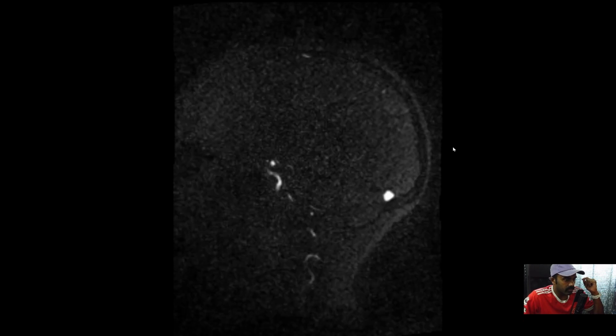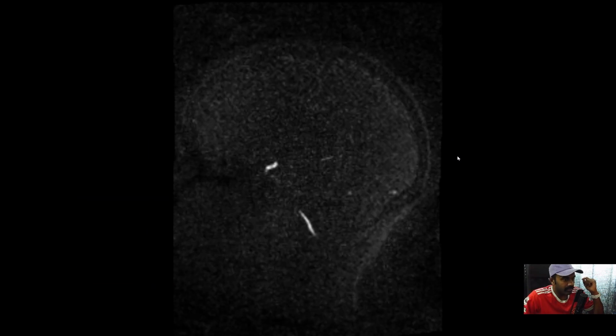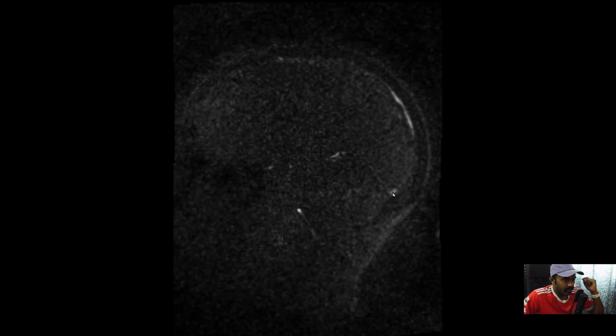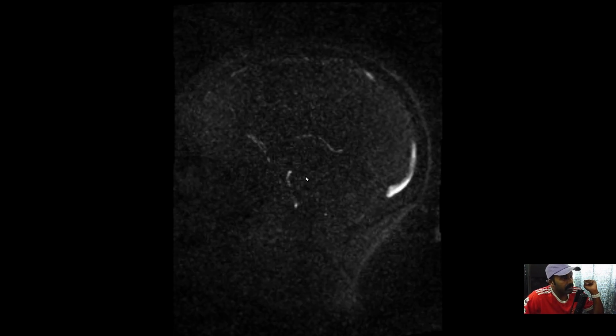The venogram was also requested. We're looking at the sagittal sections beginning from the right side. The superior sagittal, inferior sagittal, right transverse and right sigmoid sinus and the right internal jugular vein all appear intact. When we start going from the superior sagittal towards the left side, the left transverse sinus just appears a bit hypoplastic. The sigmoid is a bit more prominent as it disappears into a generally low caliber left-sided venous system. Otherwise, all the veins, the deep cerebral and internal cerebral veins, cortical veins, and the sinuses are intact.